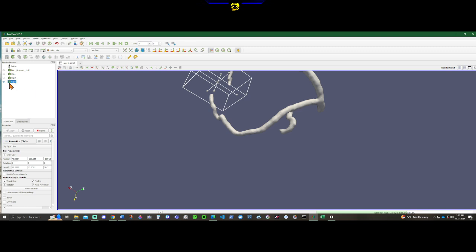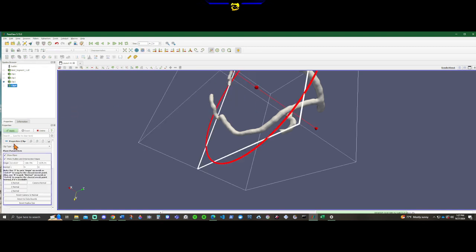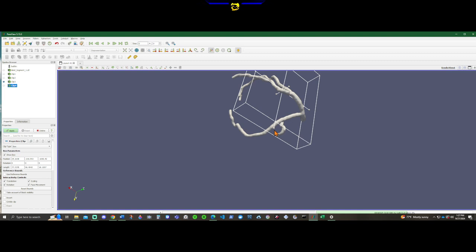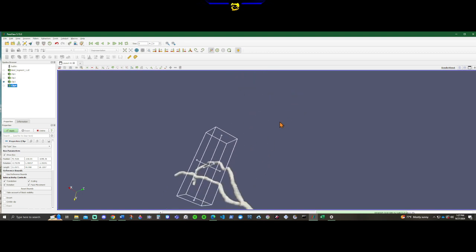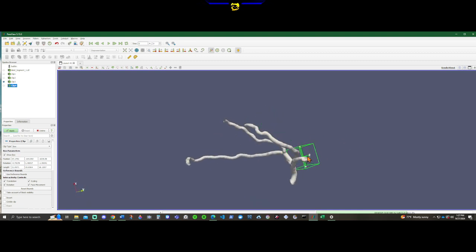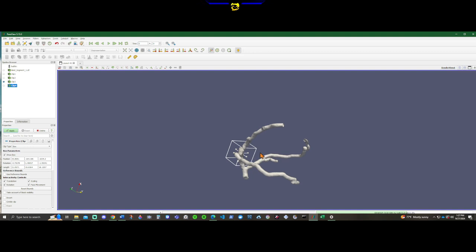Make sure you're on the final clip. You don't want to go back. Now you click another one, box, undo the invert, resize. There's no wrong or right way to do this. You just kind of have to get a feel for it.